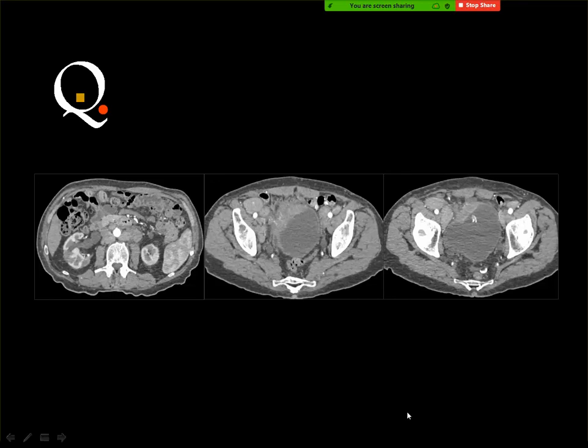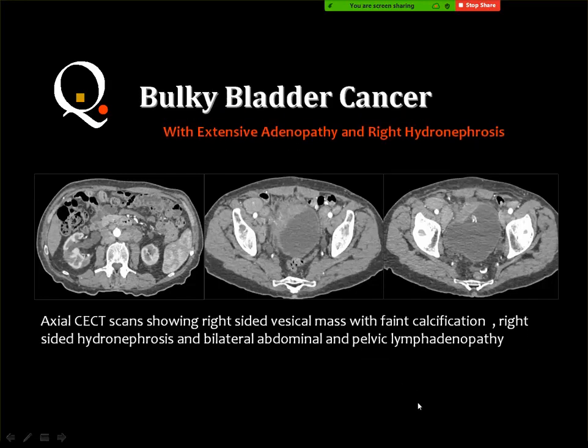Urinary bladder carcinoma and back pressure effect. Multiple urothelial carcinomas in the pelvis and the urinary bladder, with back pressure. Lymph node enlargement, metastatic lymphadenopathy. You see lymph nodes here and there and in the para-aortic area. Very good.